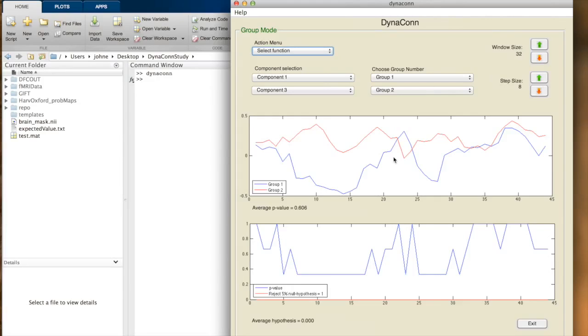And that is about it. Lastly, one thing you didn't see is that whenever I select the matrix display, it will ask if you want to let it calculate all of the DFC results, and depending on how many subjects and how many combinations you have, it could take a while. I had already done that ahead of time, so whenever I loaded this setup, it stored those pre-calculated DFNC results, so it just pops right up.